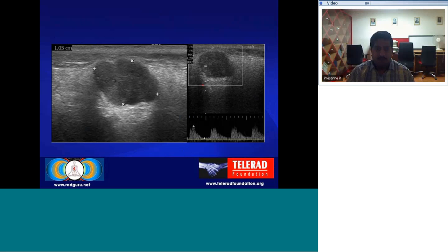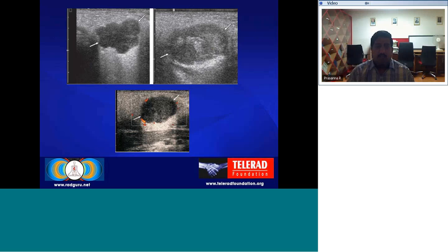So typically, the pleomorphic adenoma has a lobulated, hypoechoic, inhomogeneous echotexture. They can be solitary, or in a few cases we see that they are multiple, but the margins are clear-cut and lobulated, and a typical appearance can tell us that this is a pleomorphic adenoma.